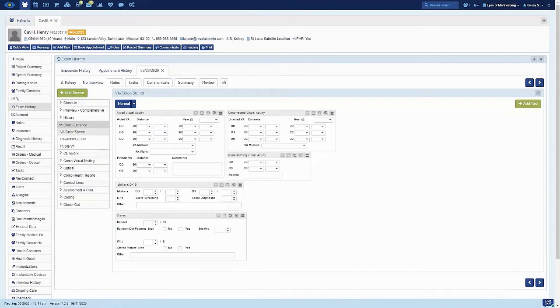Hello. In this training video, we will be covering test efficiencies and ways to help you move more efficiently through your patient's encounter. We're going to start by going to our comp entrance step, and we're going to be in our VA color stereo screen.